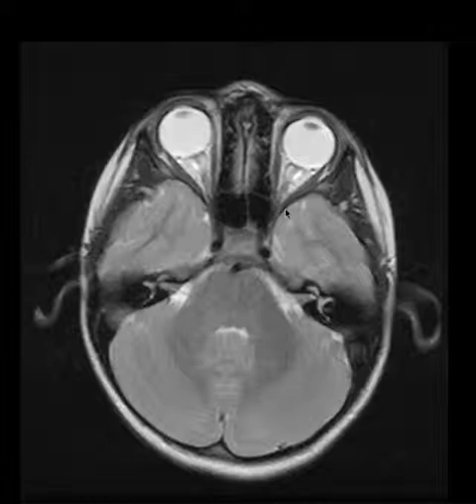Next, we have these three dots. These black dots represent vessels. Starting here, we have the right internal carotid artery, the left internal carotid artery, and the basilar artery. Little reminder that the internal carotid arteries supply the frontal, the parietal, and the temporal lobe of the brain, and the orbital structure. The basilar artery forms from the vertebral artery.